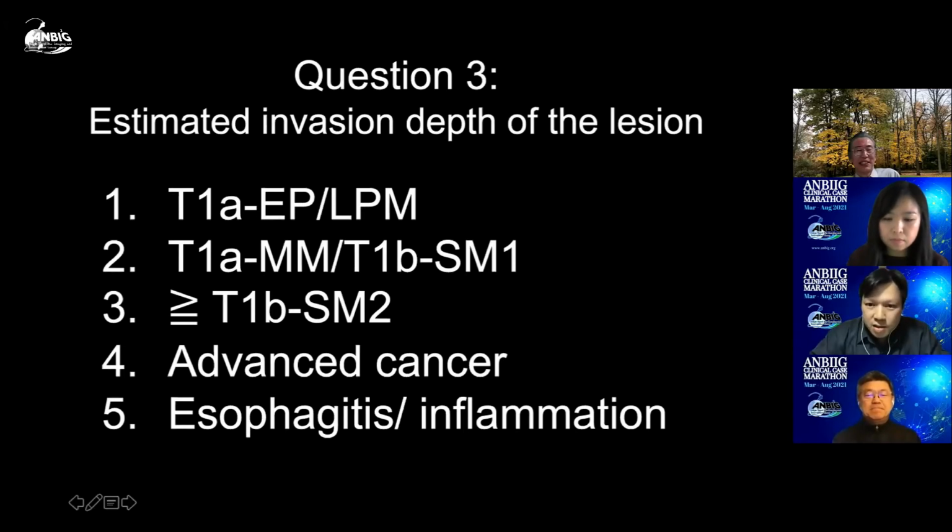Okay, I think nearly half of the audience think this lesion is an M3 through SM1 invasion lesion, and one third of the audience think this is a very superficial lesion. And 17% think this is SM massive invasion.